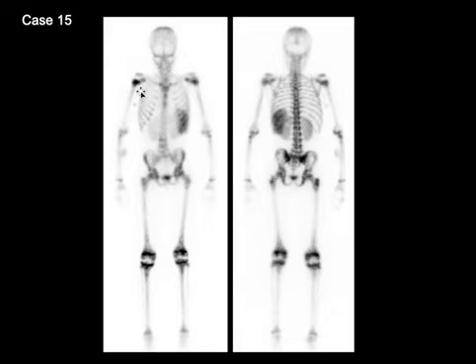osteonecrosis or bone infarction. Patient was injected with the radiopharmaceutical in the right forearm. That's the site of injection where we see that there was some infiltration, and because of which the tracer has traveled through the lymphatics, and we see uptake in a small right axillary lymph node.